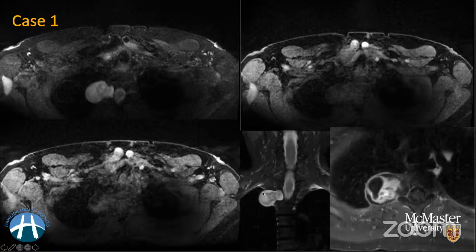Depending on where these schwannomas arise, you can have other signs called the split fat sign, and the fascicular sign. Essentially, all of them depend on the relationship of the schwannoma to the surrounding soft tissues, and the fact that schwannomas don't invade the surrounding tissue, they just displace it. These are tumors of peripheral nerves, and they can occur anywhere along the course of peripheral nerves, but this is probably a more common site. They can be seen in hereditary conditions such as neurofibromatosis 2. Cystic and fatty degenerations can be seen with these kinds of tumors.